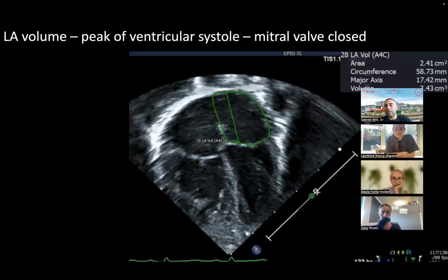So when I see patients with prematurity, who are now much older, and they have some degree of high right ventricular pressures, and I see that I have a massive ASD that is left to right, and I see my PA pressure estimated to be abnormal, corresponding to some degree of pulmonary hypertension. At this age, it's very rare that an ASD shunt, because it's a volume shunt, will create pulmonary hypertension due to excessive volume. But we know that our preemies are different than term babies.